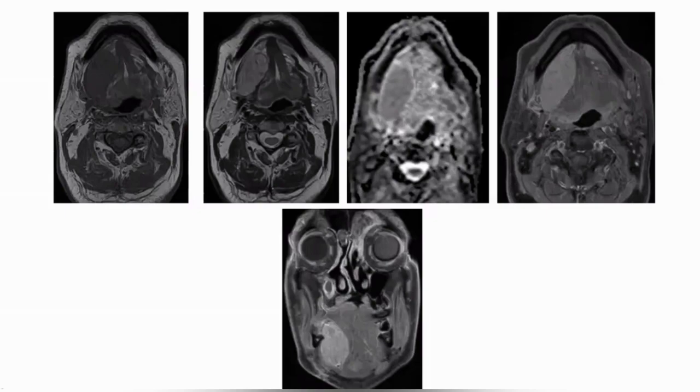However, as it is a prolonged history and no history of fever and no acute onset, I would rule out the differential diagnosis of any abscess formation.